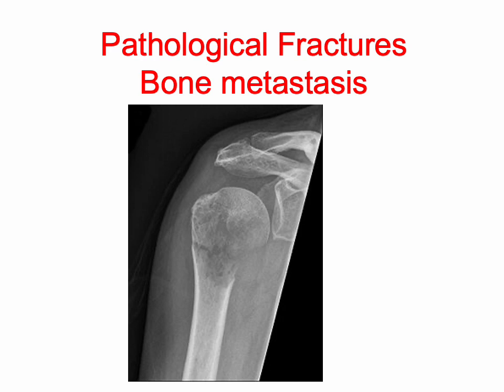Again, we've got a fracture through the proximal humerus here on this underlying loosened area of bone. We've got complete loss of cortex here. It's not as easy to get a marker and draw exactly where normal bone meets abnormal bone, which means there's a wide zone of transition. These are things that flag you to think this is a more aggressive lesion.